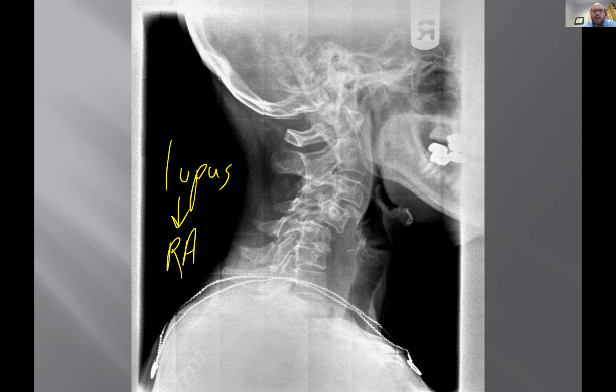And so you wonder, is this related to the patient's lupus? And probably the answer is yes. Now, the fact that the mandibles are pretty well lined up, and yet I see a pedicle here, but I don't see pedicles here, would suggest that not only is it slid forward at 4 on 5, but there's a component of what?